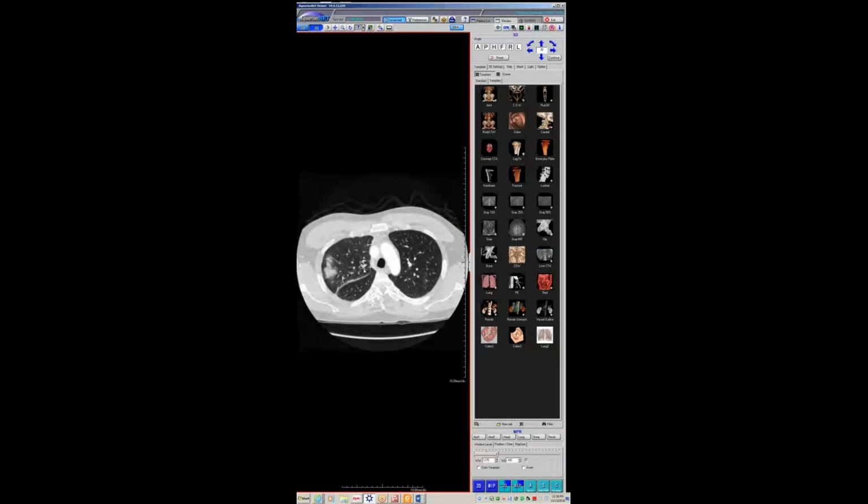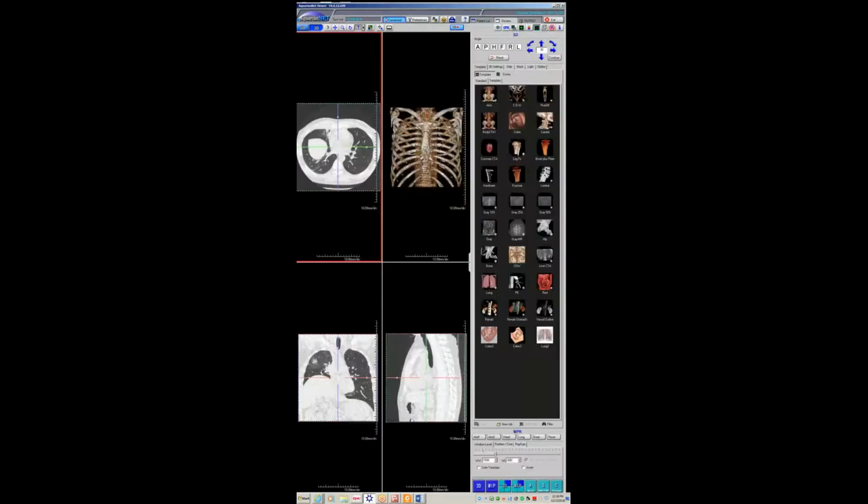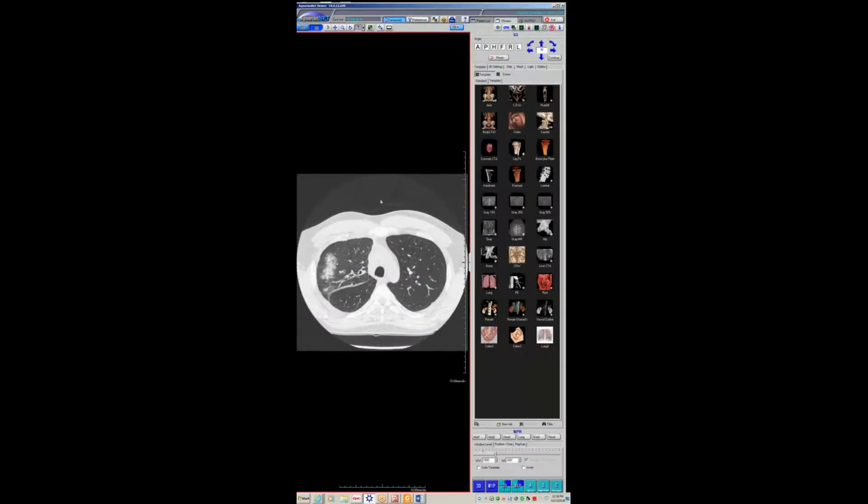And you can also see that the lymphatics around the airways and the septa are kind of thickened in this lobe in general. The lobe is somewhat smaller. And if you look at the density, it's somewhat increased. And we'll see over time that these opacities kind of shift in their appearance. Here it's kind of breaking apart. You got a little bit of a crazy paving pattern with some of these areas.